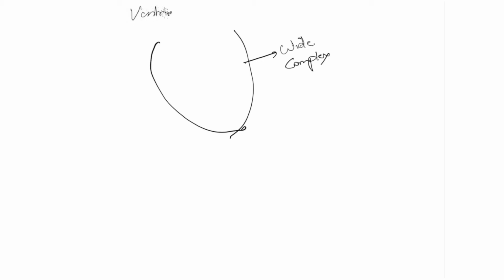Now, sometimes the impulses might just originate from the ventricles, and impulses originating within the ventricles are usually wide complex. So, in essence, ventricular arrhythmias are wide complex. Some common examples would include the following.